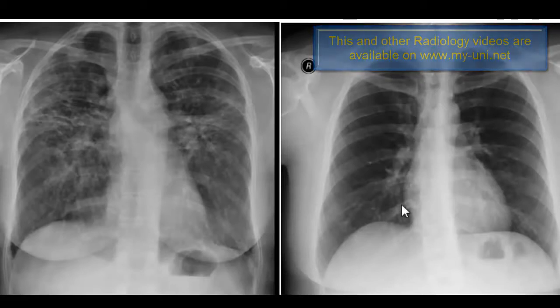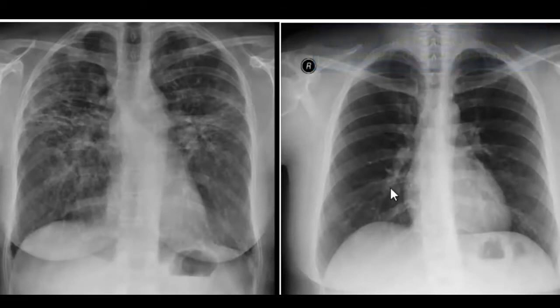Once again, our normal chest X-ray is in front of us, and compare it with the X-ray that is visible on your left hand side. Now, if you have seen a few normal chest X-rays, you'll realize very quickly that there is definitely something wrong with the patient on your left hand side. The mediastinum is white in this area on this patient.